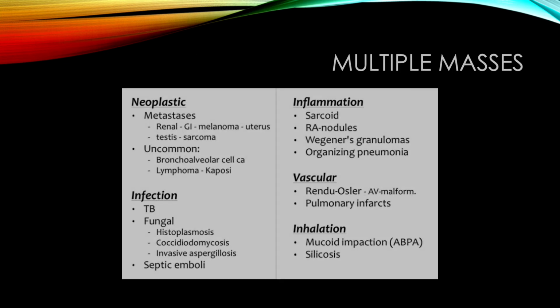The differential diagnostic list of multiple masses is very long. The most important diagnoses are listed in the table. Sometimes it is difficult to differentiate multifocal consolidations from masses.